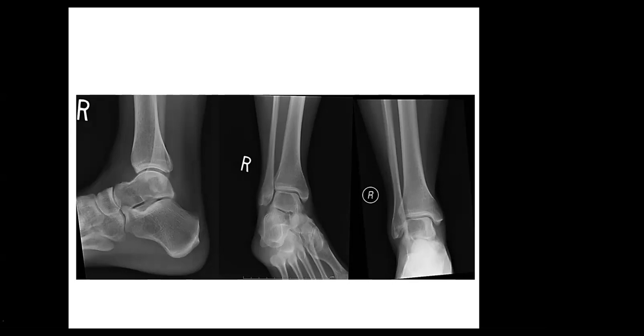If we just had the radiographs here without MRI, and I told you there is a subarticular lesion in the talus with narrow zone of transition, what would you think of in terms of differential diagnosis? With a skeletally mature patient and a lytic lesion with narrow zone of transition, subarticular, giant cell tumor would be the first differential. Yes.